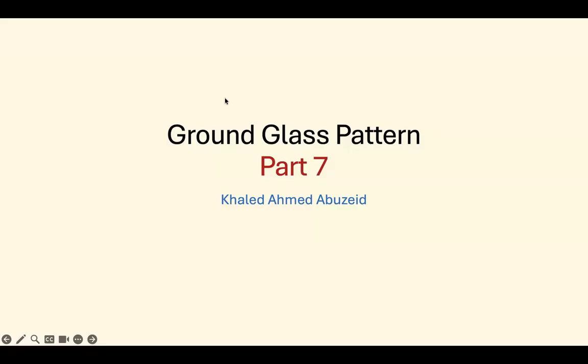Our topic today in the ground glass pattern part 7 will be focused on one entity.